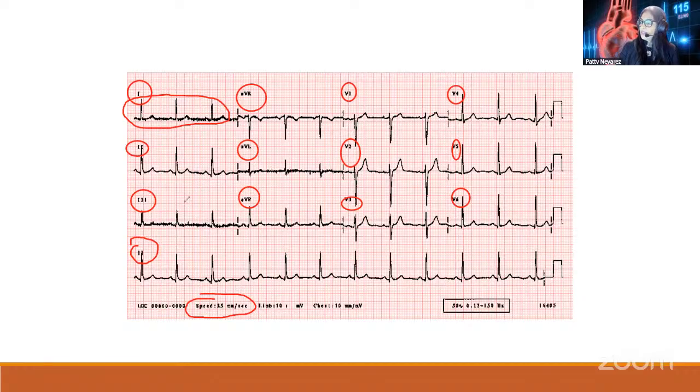By the way, in this case, you can see a lot of wiggle here. We're going to call this artifacts. That could be touching something, or there's no movement on this patient. You can see it's a steady line, but it could be something interfering with the electrical signal. But it's okay. If we're going to determine something else, we can use other leads. Okay, so let me just erase all this.